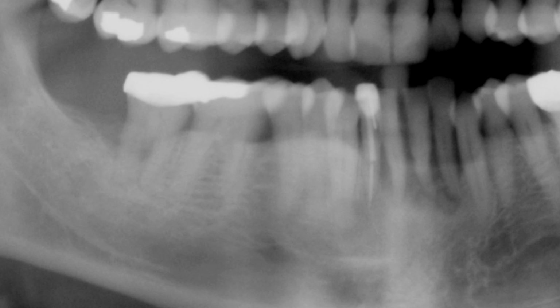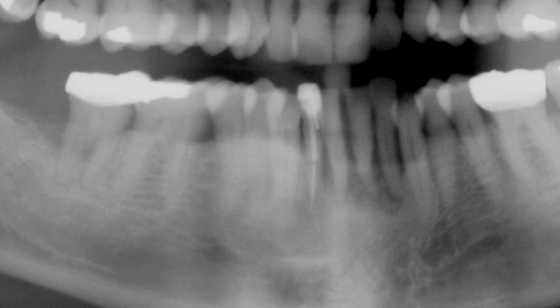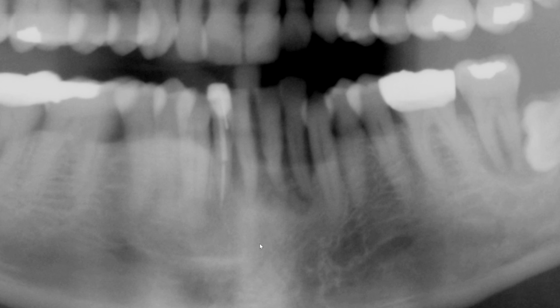Given the name periapical cemento-osseous dysplasia, in most cases these lesions will occur in the periapical area. So you want to look for the periapical areas. Again, I'm noticing occasional bone loss involving tooth number 31. By now, if you have spotted in the anterior mandibular region, you're absolutely correct. I've already given you the diagnosis, right?